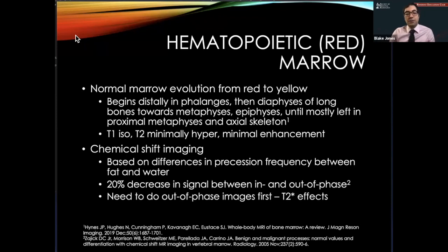And the other point that I want to bring in here is one of the advanced imaging techniques, chemical shift imaging. The physics is above the scope of this talk for now, but basically, based on the differences in precession frequency between fat and water in the same voxel, their signal cancels if you do have fat and water in the same voxel.